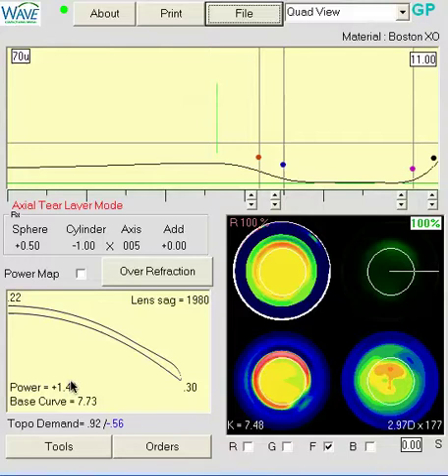This is an orthokeratology case that started out as a hyperopic case. In this video, I'm going to do a demonstration for molding cylinder, and we're going to ignore the plus 50 and just try to get rid of minus 1 cyl, a diopter of corneal cylinder. This is a pretty low overall prescription. The topography does have some unique features to it, so I would definitely proceed with caution, make sure the patient has the correct expectations, and hopefully we can get an overall successful case.